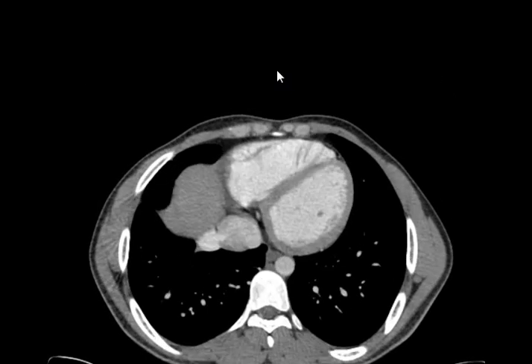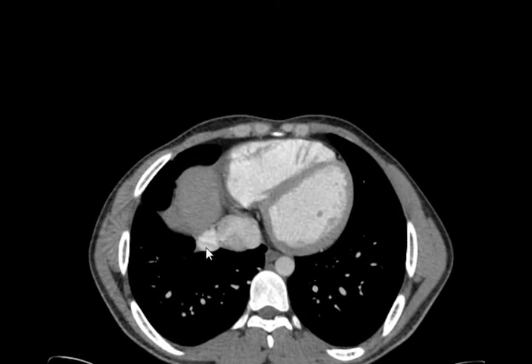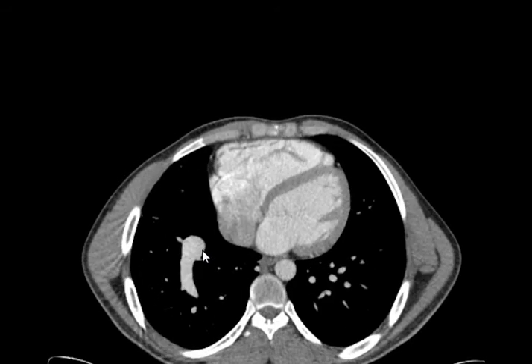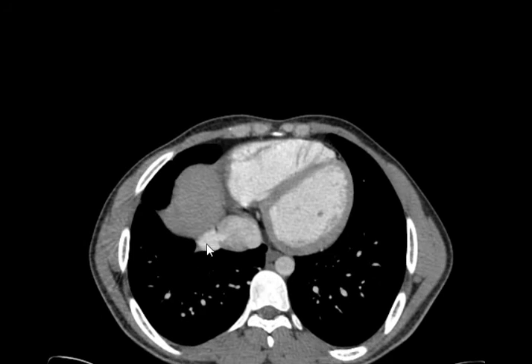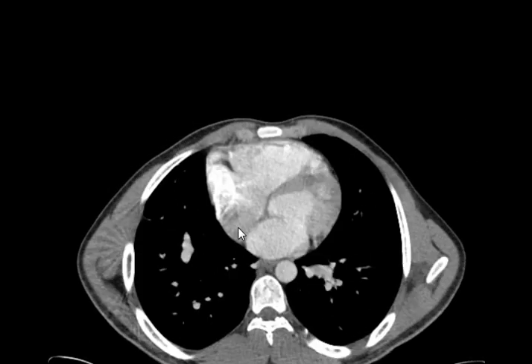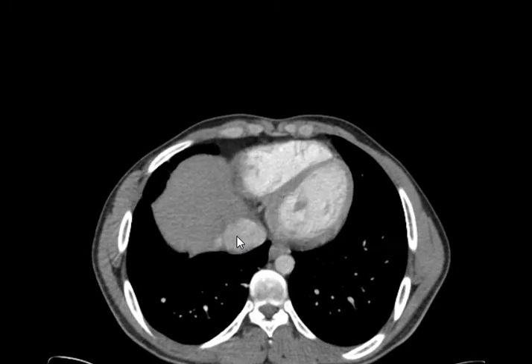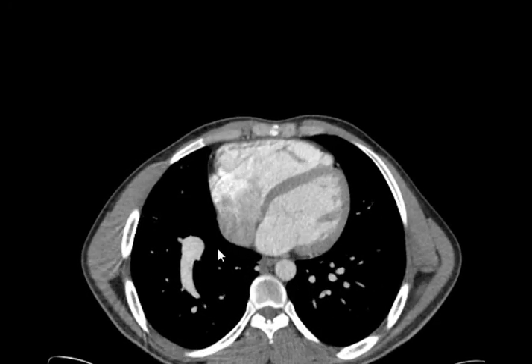So, what do we have? Dome of the liver. Here. Okay. This one you have a vessel extending up. Arising from where, this vessel? Portal or inferior caval? مو portal or اختاري واحد, portal or inferior. What vessel is this? Inferior, this is the IVC. So it's arising from the IVC. Okay. And it is coming from the lung.